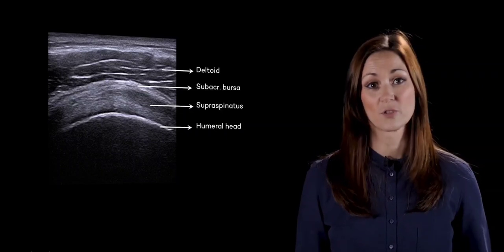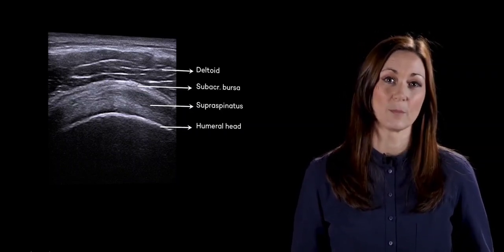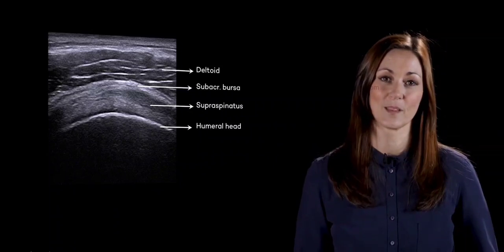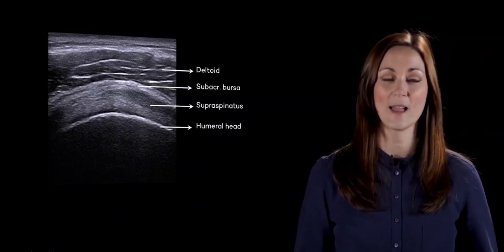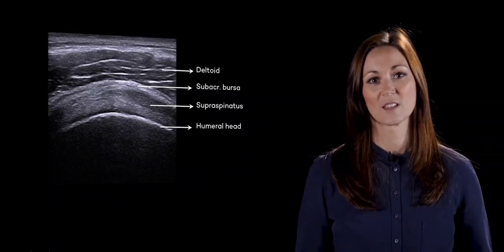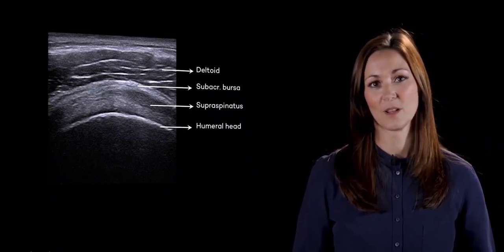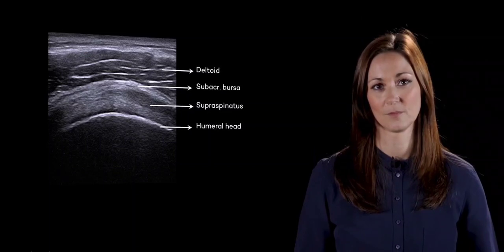I can show you hundreds of different anatomical structures and even more pathologies, but let's keep it clear and simple. Let's just focus on a few normal, everyday pathologies of the supraspinatus tendon. On this slide, a healthy transverse supraspinatus is presented. Please memorise this picture.